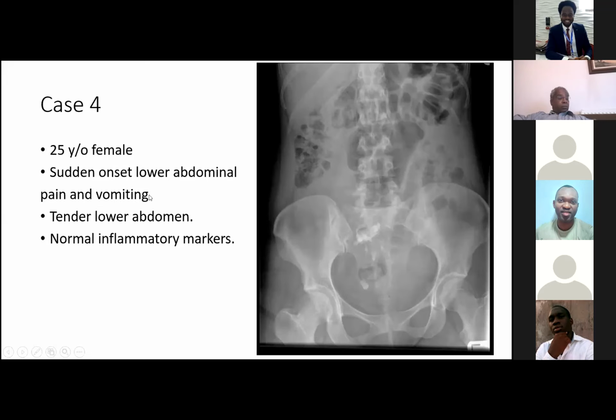Very good. Just by looking at them, can you tell what they look like? Just by looking at one of them, let's focus on the one that's lower down in the pelvis. What does this look like to you? These are the tip of the appendix.